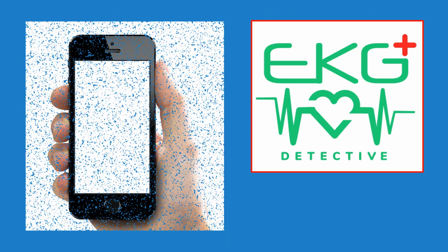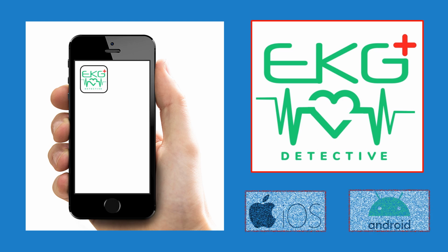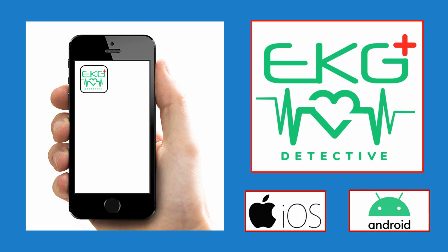The second job aid that we are going to be using is the EKG Detective phone app. The app, unfortunately, is no longer available for Androids at the Google Play Store due to technical support issues, but it is still available at the Apple Store, and you can just keyword search EKG Detective, and that will take you to the page to be able to download a copy of the app. But you definitely don't need to have the app to be able to work through the process of deduction.